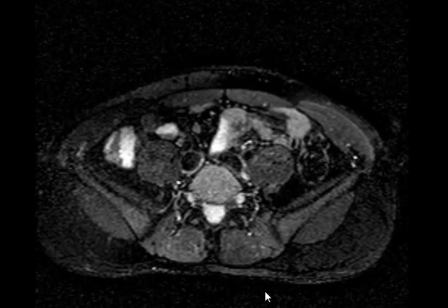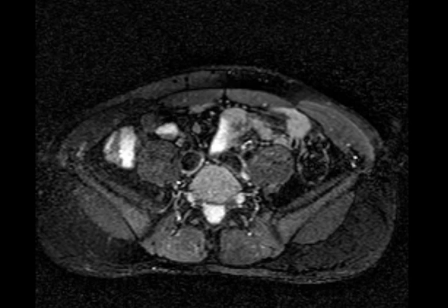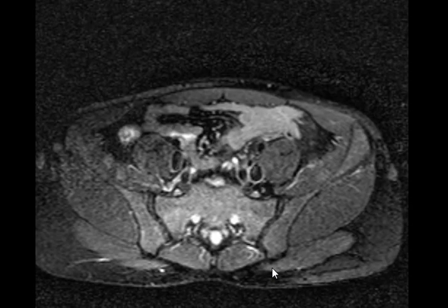This is a 16-year-old patient, and I'll give you just this history. You will figure out 16. Okay. Let's see what is going on. Pelvis MRI. I really don't know.